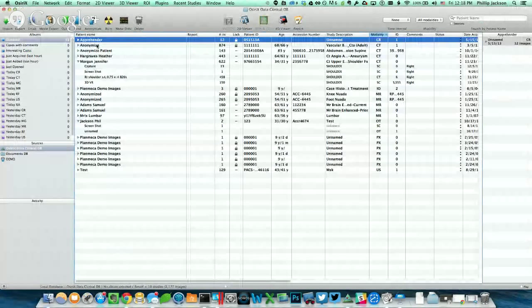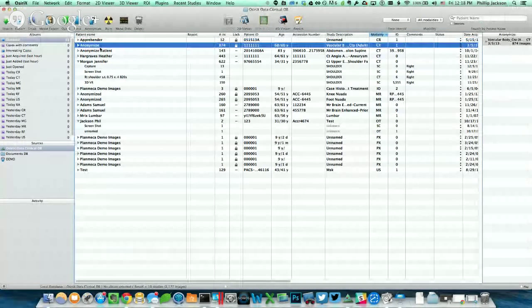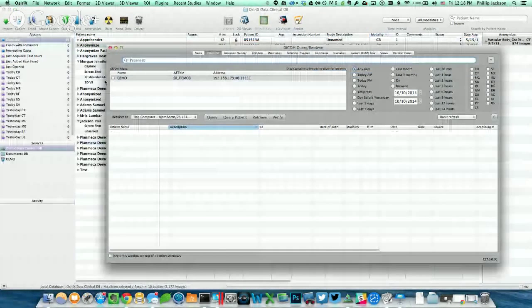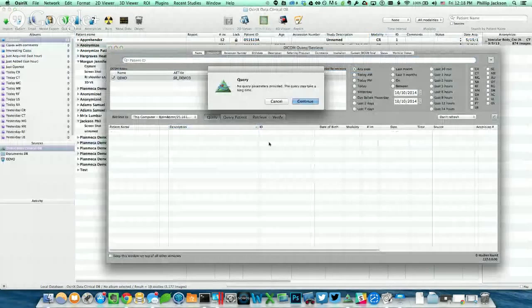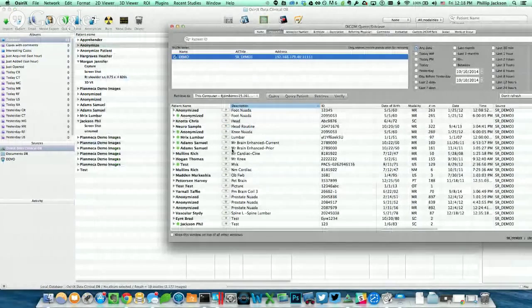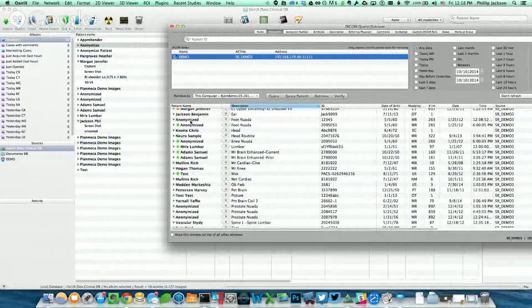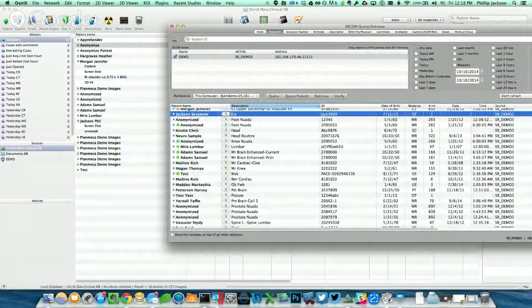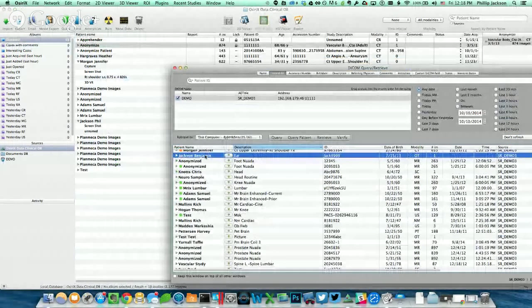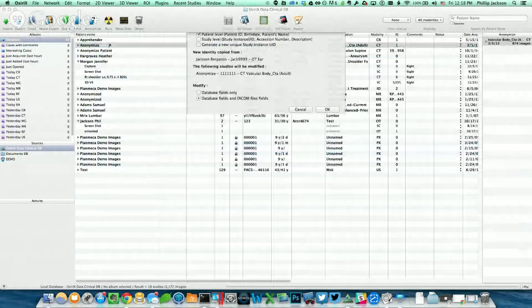We're going to pretend that this anonymized data set right here is the one that we've imported. I'm going to go ahead and query my PACS system. This is my cloud account at Purview. And I'm going to find the patient's study. Let's see here. Benjamin Jackson. This is actually Benjamin Jackson's CT scan. I'm going to drag the study on top of the data set that I've imported.